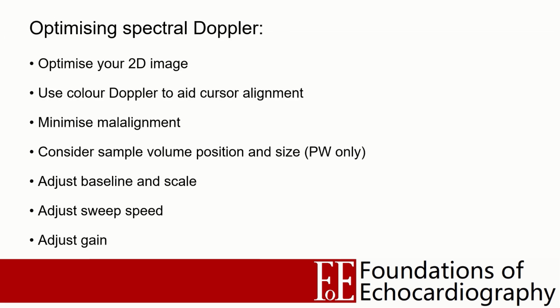Alright, so to quickly recap, whenever you're using Spectral Doppler, you should take care to optimize the graphs that you're using to make your measurements. This is the sequence of optimizations that I employ and recommend to my trainees.